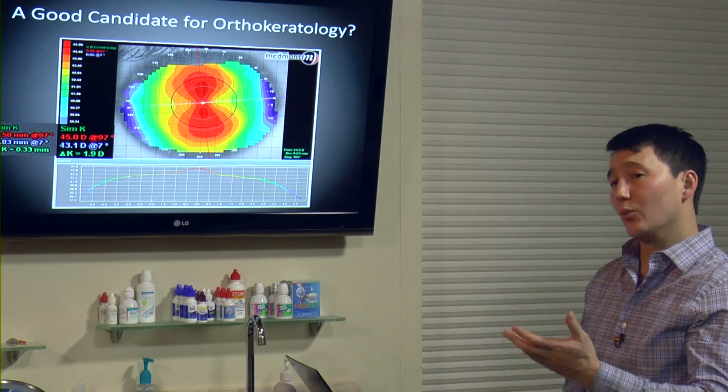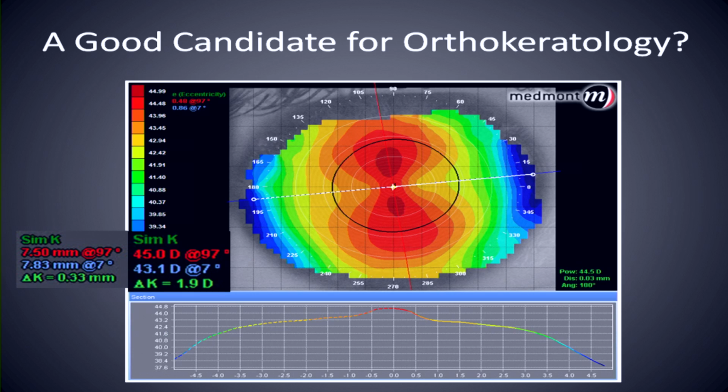Now the same thing is, could we adapt this to orthokeratology as well? Now here's a patient with 2 diopters of corneal cyl, but it's not just the central astigmatism, it's limbus-to-limbus astigmatism.